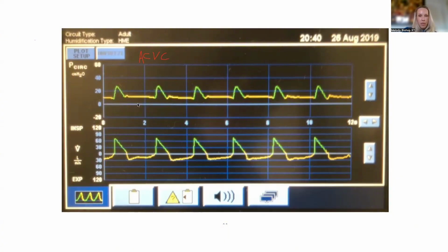Yep. But then with that, my eye directly goes to what I expect the pressure waveform to look like, which you can tell you do not have in this. So right here, this is screaming to me that there is something wrong.